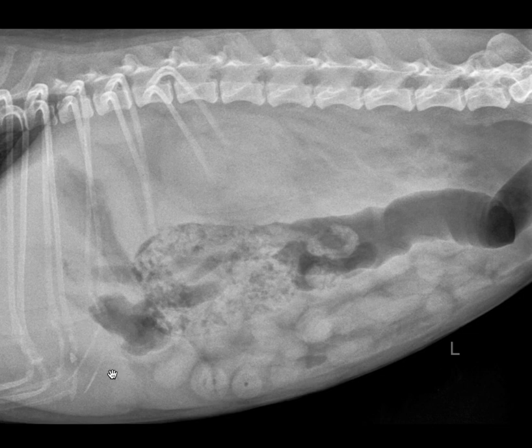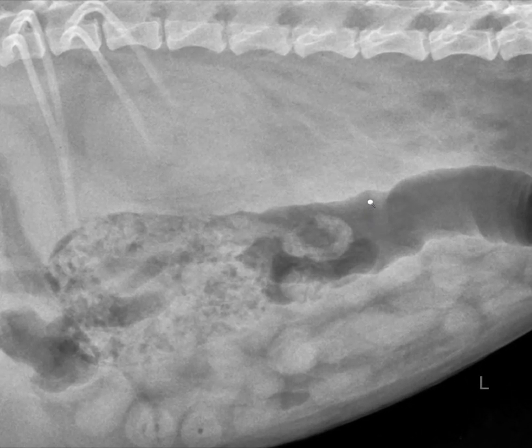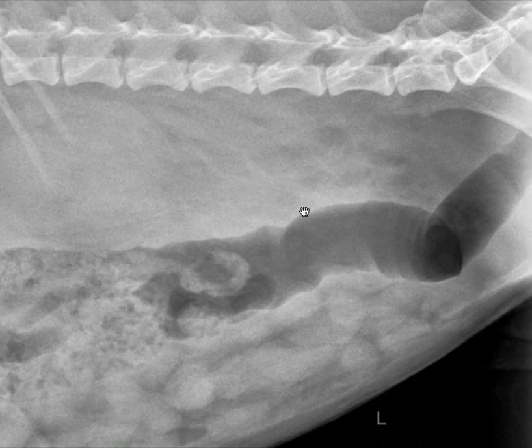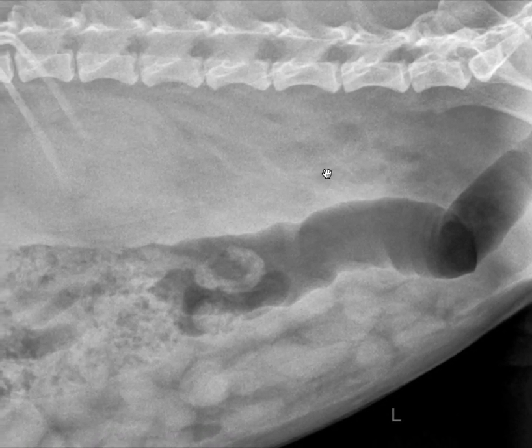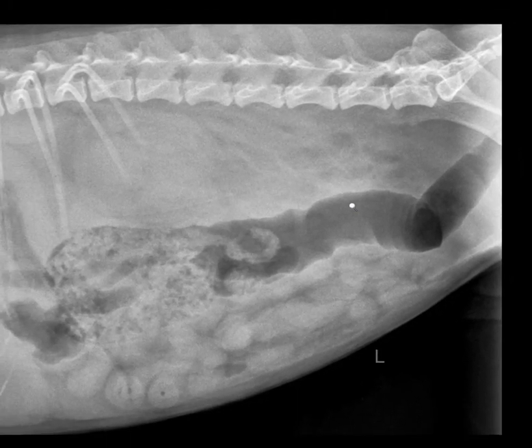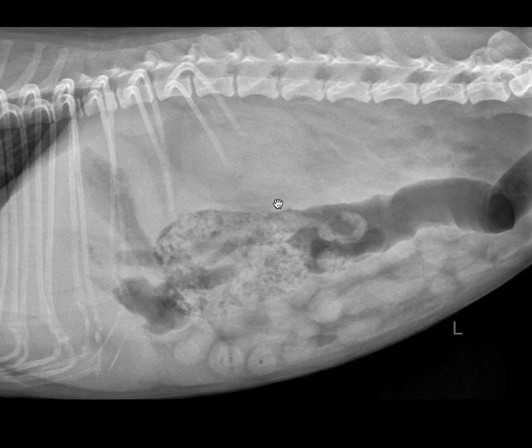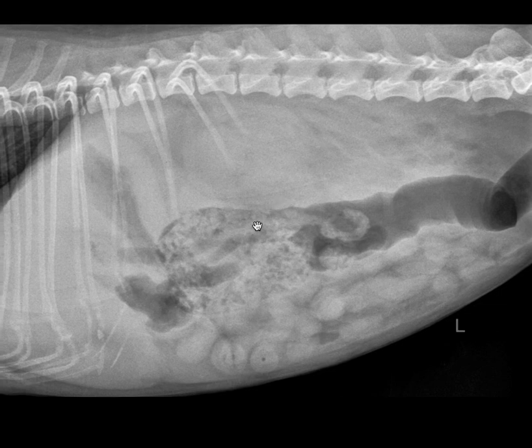When I look at the left lateral radiograph, especially for this case, I see an increase in soft tissue opacity here in the region of the retroperitoneal space. Let's go in a little closer so that we can see not only is there increased soft tissue opacity, but there remains some fat opaque features. This gives me the overall impression of fat stranding or mixed opacity, which is very common with fluid. You can see that the retroperitoneal fat is nearly completely obscured, but some fat remains, as if the fluid is interdigitating. Evaluating the renal silhouettes is quite difficult. This is border effacement created by the retroperitoneal fluid.